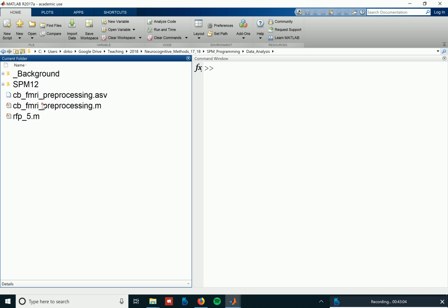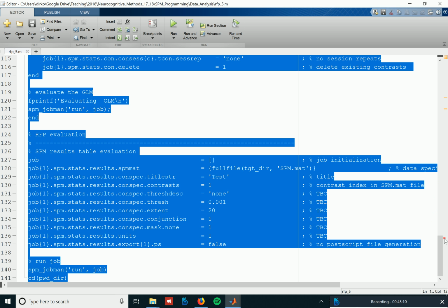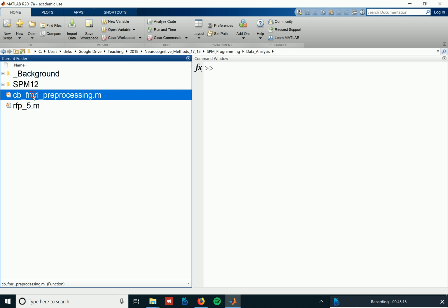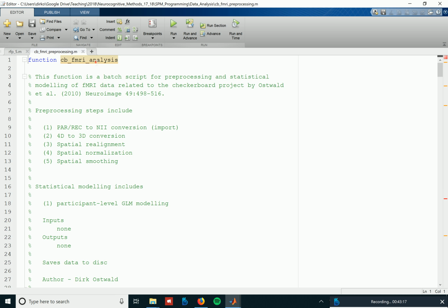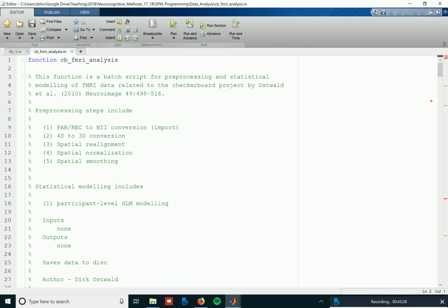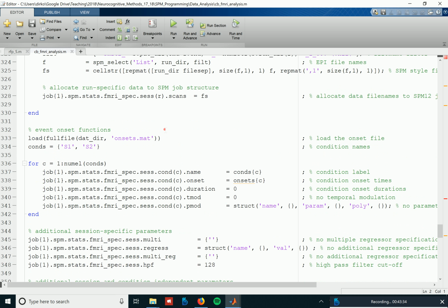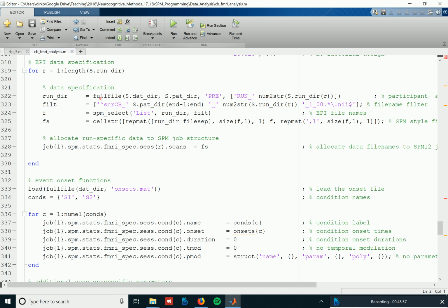So let's then just make sure that, oops, oh, a nice safety test, the new name. Now I'm running out of time again. Let's see whether we get that in the last minutes. So we are in this folder. No, we have to actually do this for each.